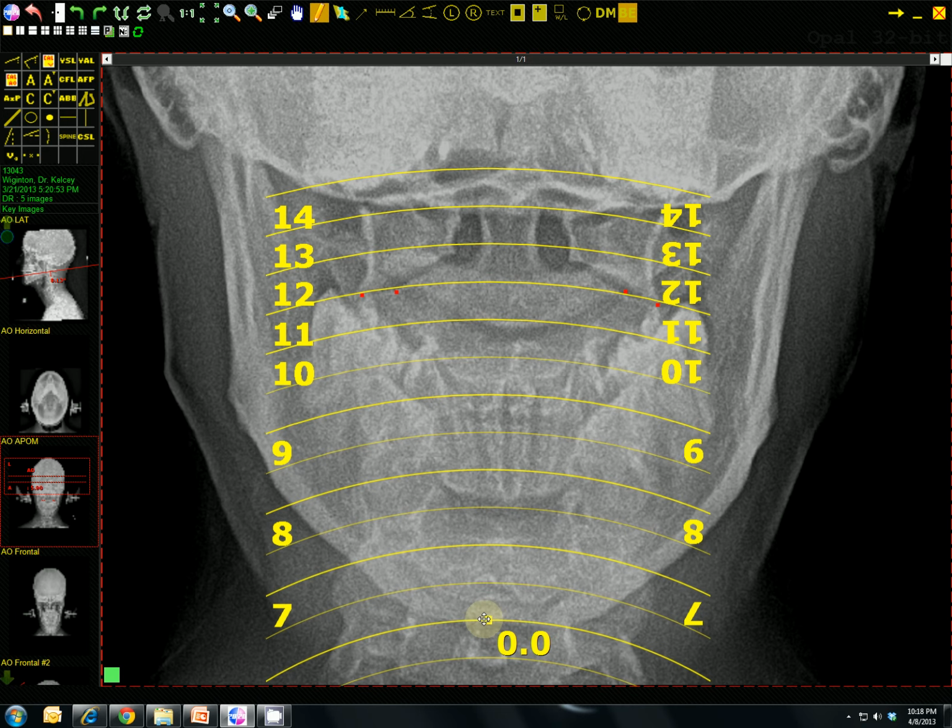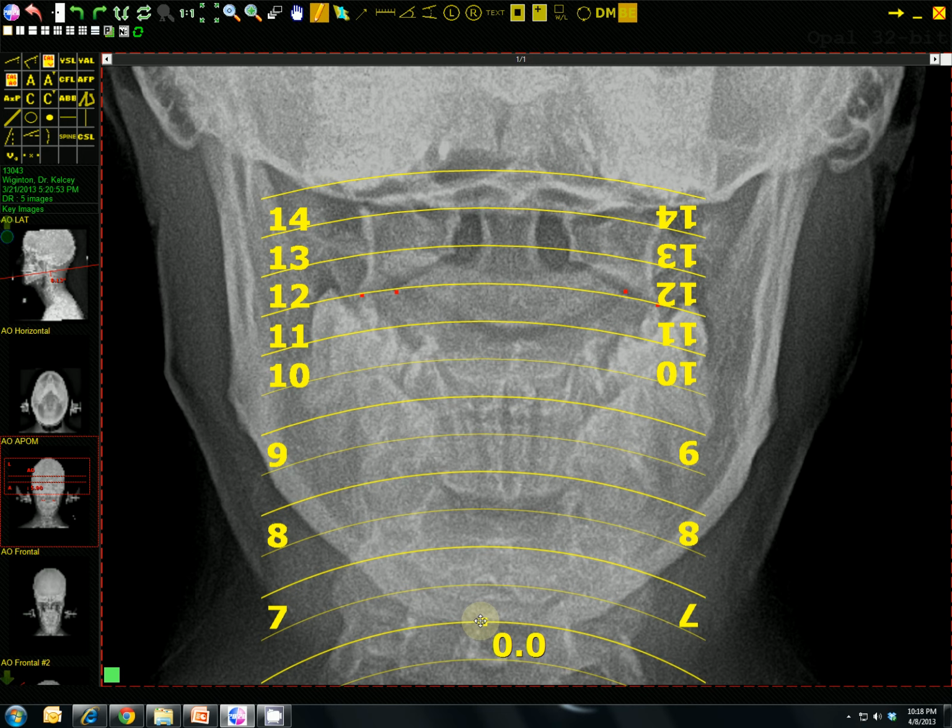That is at a 12, or no, I guess that's 11, because again, we're going up like that, so 9, 9.5, 10, 11 right here. 11 is still on the outermost edges right there, and touching the top now. So you would add 11 plus the 6, and then divide it by 2.